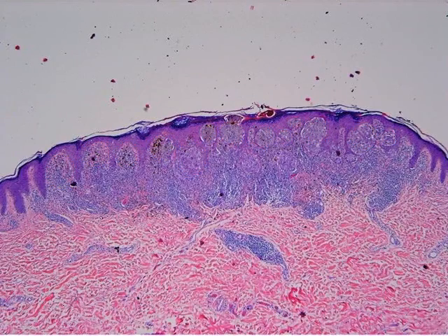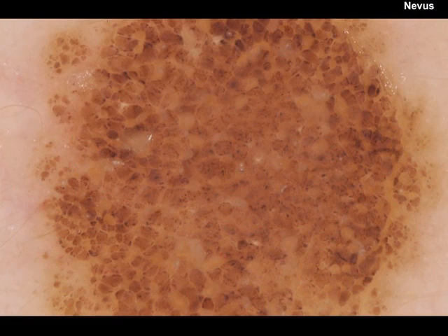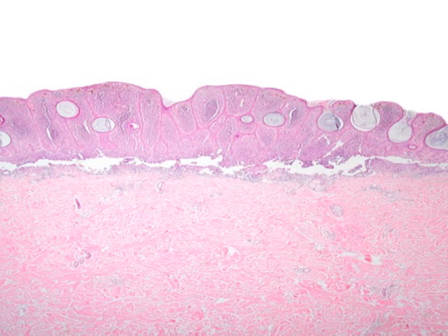Here are globules as well, the brown. So here are your globules. And in between are sort of yellowish structures, right? So yellow, you can already predict what that's going to be. And when we look at it, you'll see that the brown structures are your nests of melanocytes, and then your yellowish structures are your keratin within this congenital type nevus that has also some milia cyst.